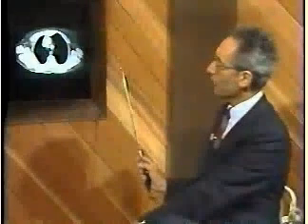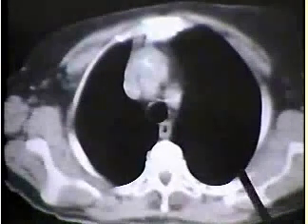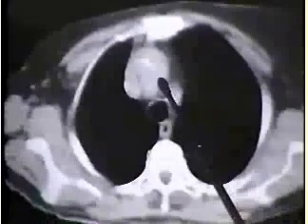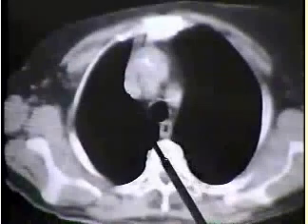This is the highest cut in this patient that I'm going to show you. We should be seeing the 3 arteries and the 2 veins. Well, everything is very big and irregular. Subclavian artery looks huge. I can't really identify the common carotid very clearly. This is the brachiocephalic artery, and this is the right brachiocephalic vein.